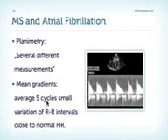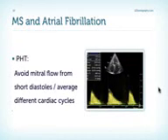You should average 5 cycles, and you should try to find cycles where you have fairly equal RR intervals, which are close to the normal heart rate. The same is also true for the pressure half-time, where you should also average several cycles, and where you should also use cycles where you don't have a diastole which is very short.